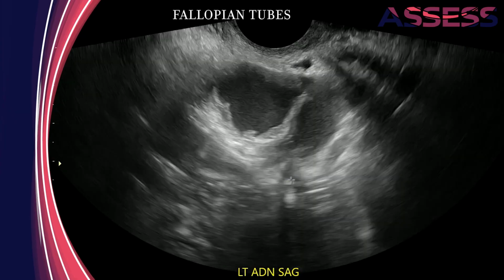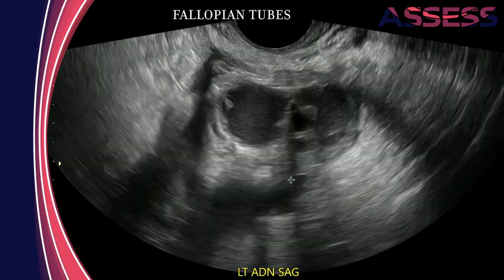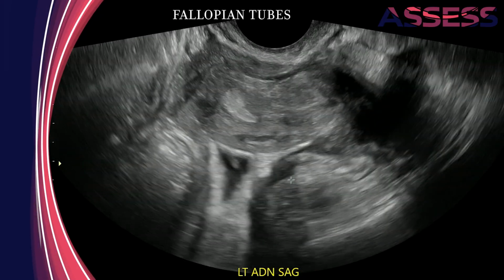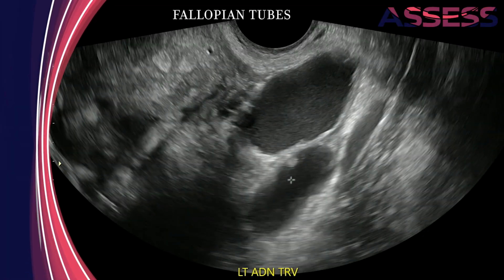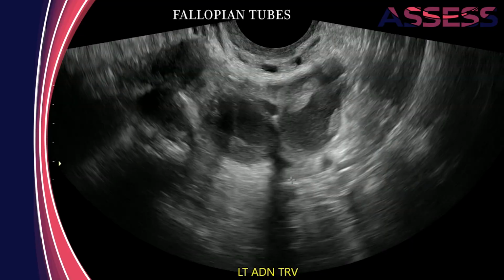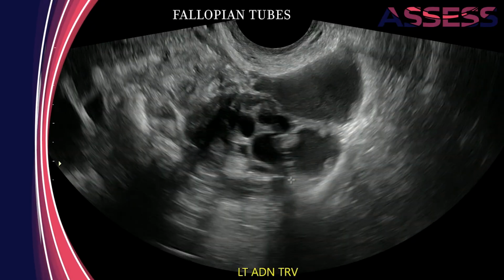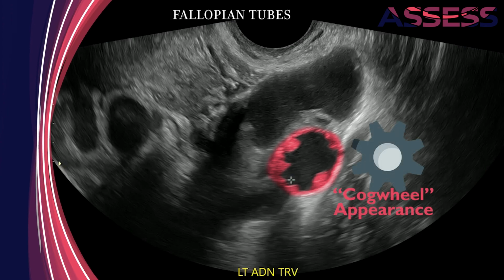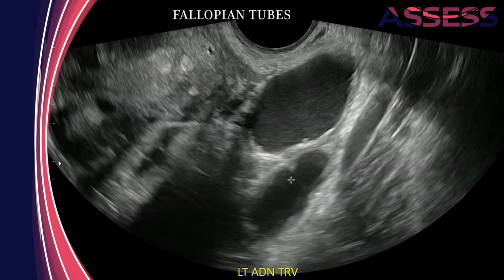Adhesions can distort the fallopian tubes and occasionally cause tubal occlusion. If this occlusion occurs near the distal end of the fallopian tube, a hydrosalpinx or hematosalpinx may develop. A hydrosalpinx is a well-circumscribed cystic structure and can appear as an echolucent tubular tortuous space with incomplete septations, and will often have the classic cogwheel appearance, meaning that, when imaged in cross-section, there are small projections from the wall into the lumen of the tube.